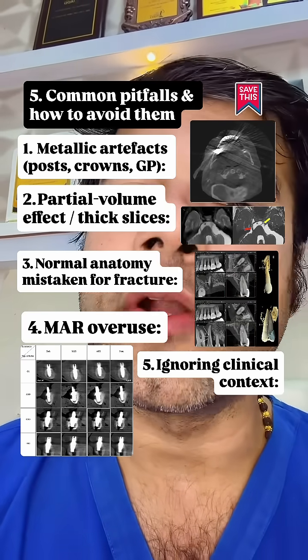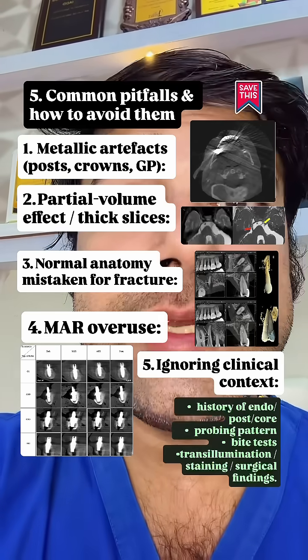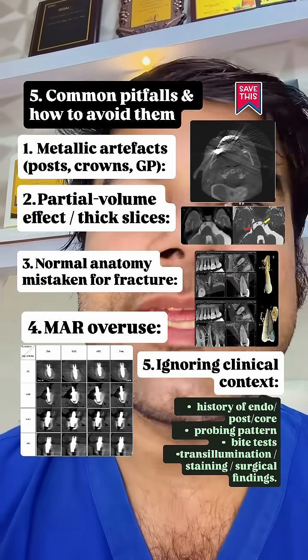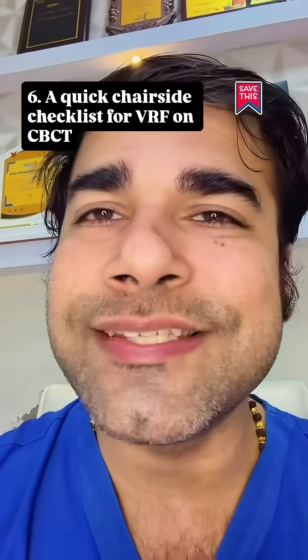Ignoring the clinical context. CBCT alone should not be the sole determinant. Integrate with the history of endo, post, core, probing pattern, bite test, transillumination, staining or surgical findings. So what should be your quick chairside checklist for vertical root fracture on the CBCT?